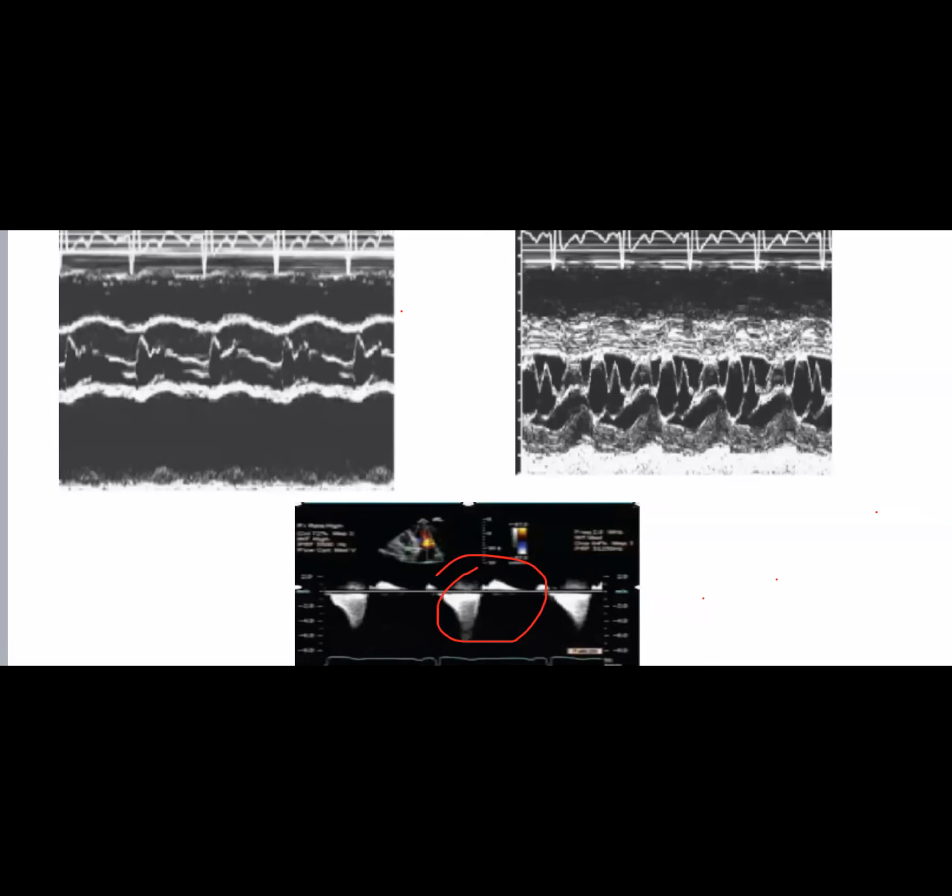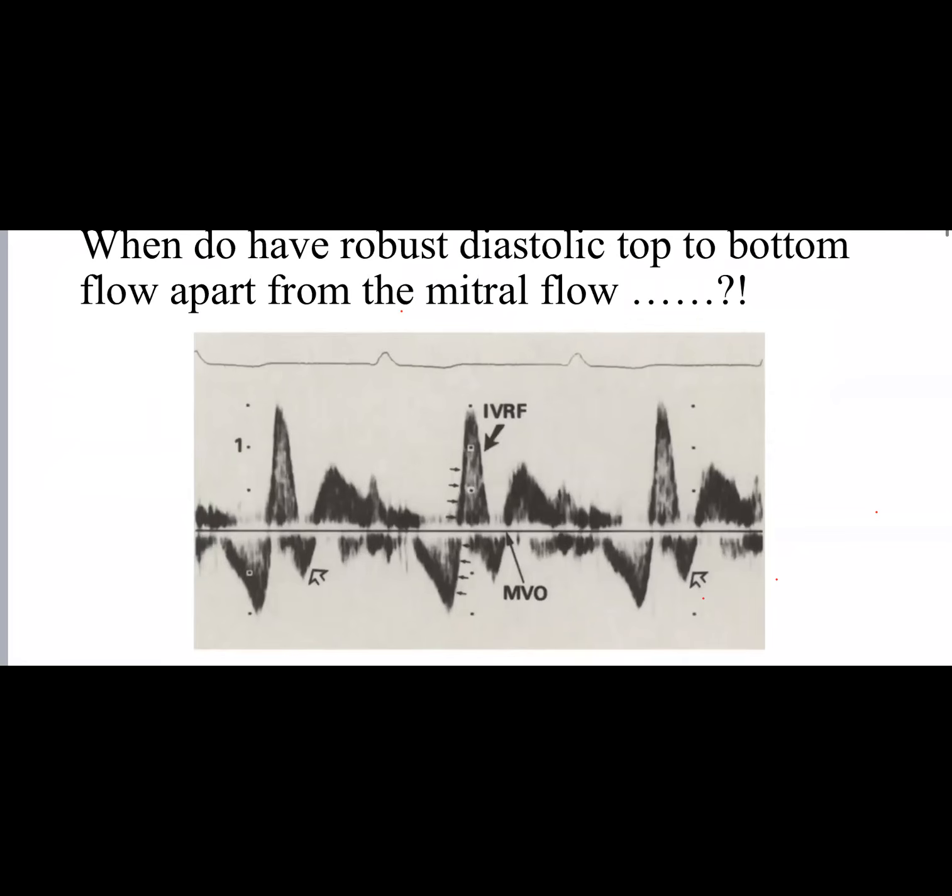Okay. And what about this one here? Here mid-systolic closure. Exactly. Mid-systolic closure. And what is here? SAM. Exactly. And what else? You see the septum? Hypertrophy. Exactly. Yes. Good. You are so good, actually. This is a bit tough. That's why we're just going for it.